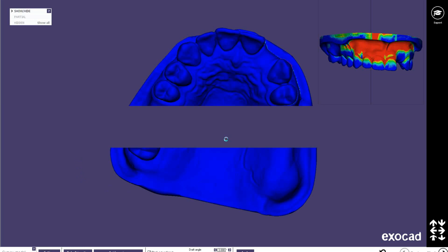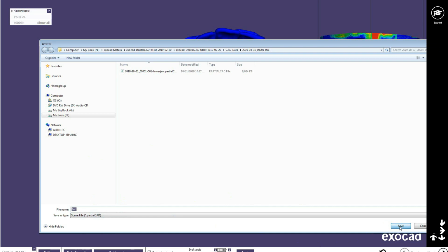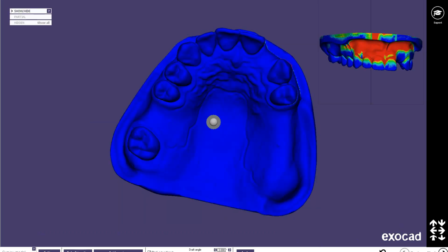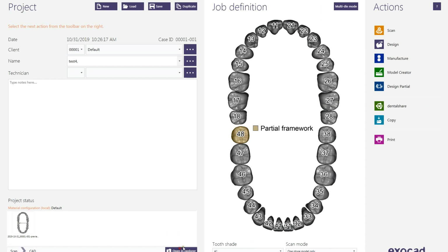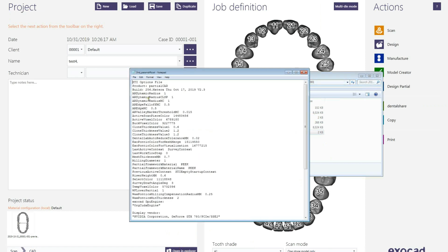And we're not going to bother to apply or build anything. And actually I didn't need to do a save as. I could have done a regular save. Okay, drop out of here. Open an Explorer. Okay, so param diffs.txt. And here they are, edge fall off and edge major connector. So that was the step that was required.